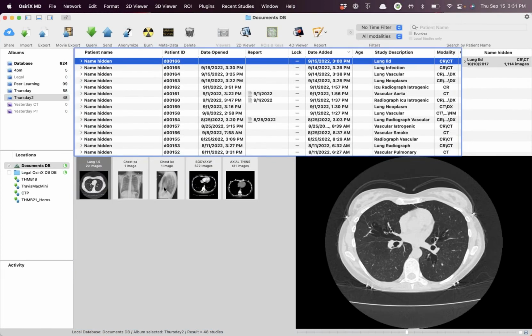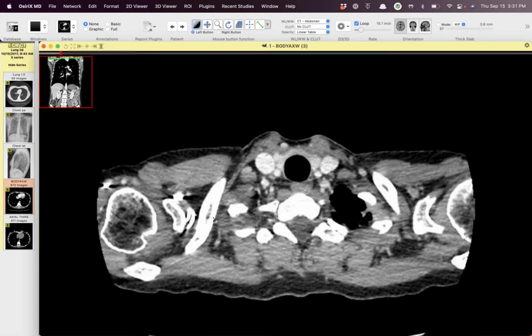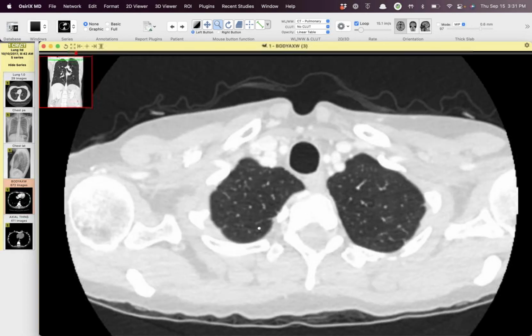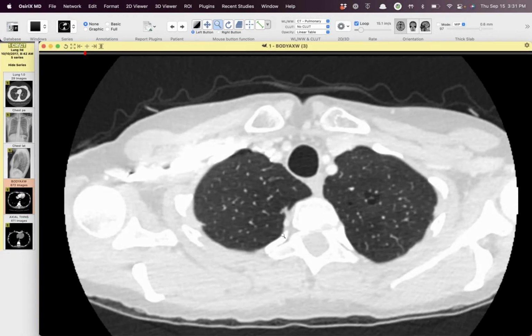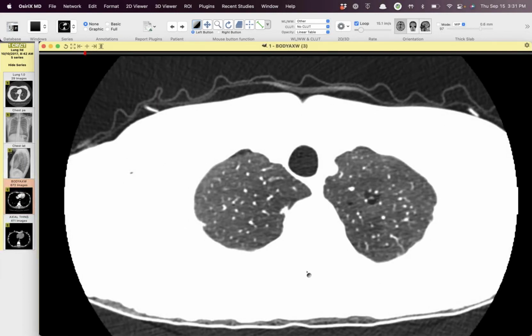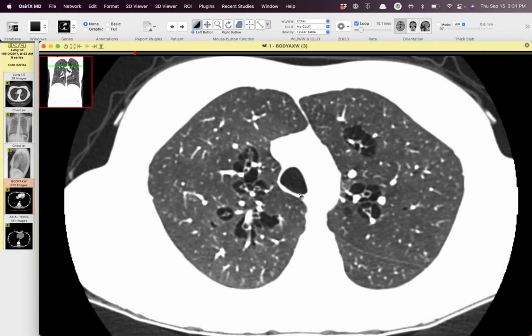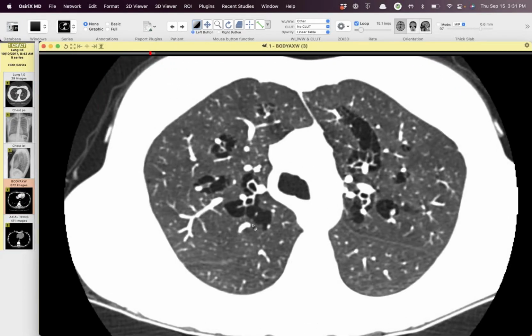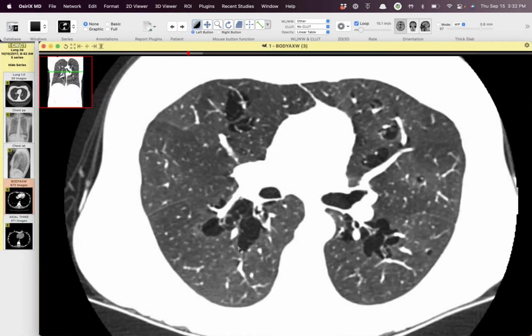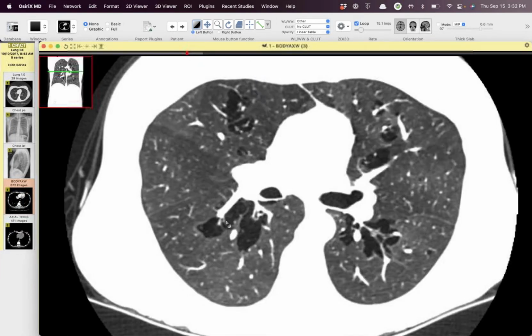And then this is one of those ones that belongs on the FBI most wanted list, like, have you seen this look before? This is from a couple months ago. Let me see if I can window it, but you'll see scrolling through here, I'm curious if anyone has thoughts on this, because Paige showed this to me. He found one case report that I can discuss in a minute. He asked me if I had seen anything like this before, but you can see it's not the airways, but it is along the airways.